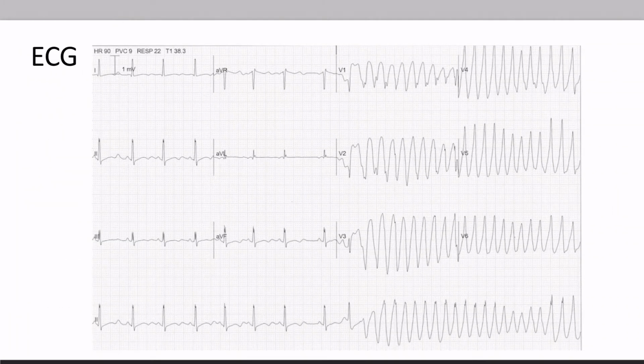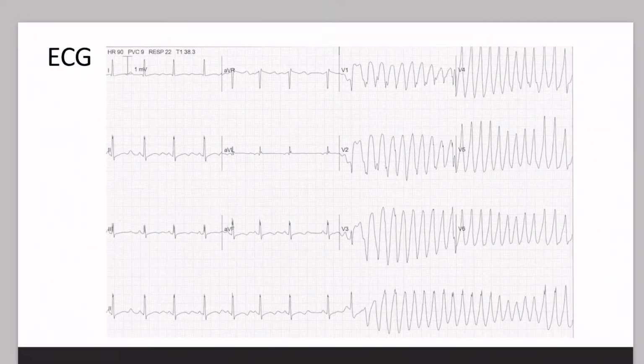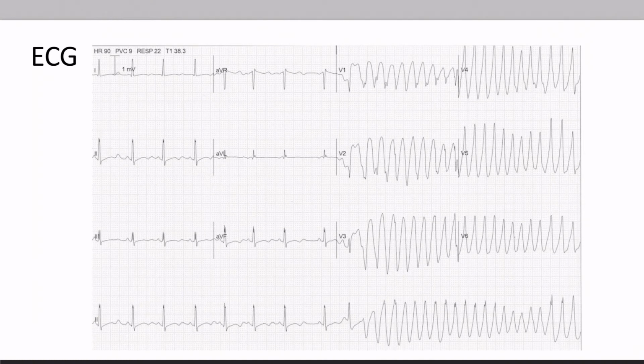Alright, so what we're going to do is use the 6-step method that we outlined in our ECG Basics tutorial video. And you can find this on our YouTube page as well as our Facebook page. So the first thing we're going to do is look at the rate. So we'll zoom in here to the bottom. Actually, this is one of the easier overall rhythms to get.